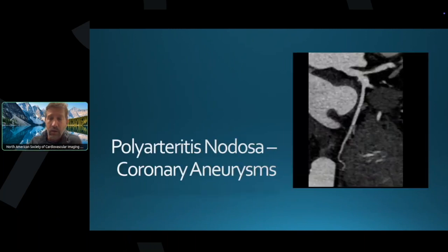Any questions regarding that one? I just digressed a little bit into vasculitides there. Beautiful case. I have never seen polyarteritis nodosa. Yeah, as I said, it is the only case I have of this proven PAN. But keep in mind those large vessel vasculitis and the occasional rare case like this one.